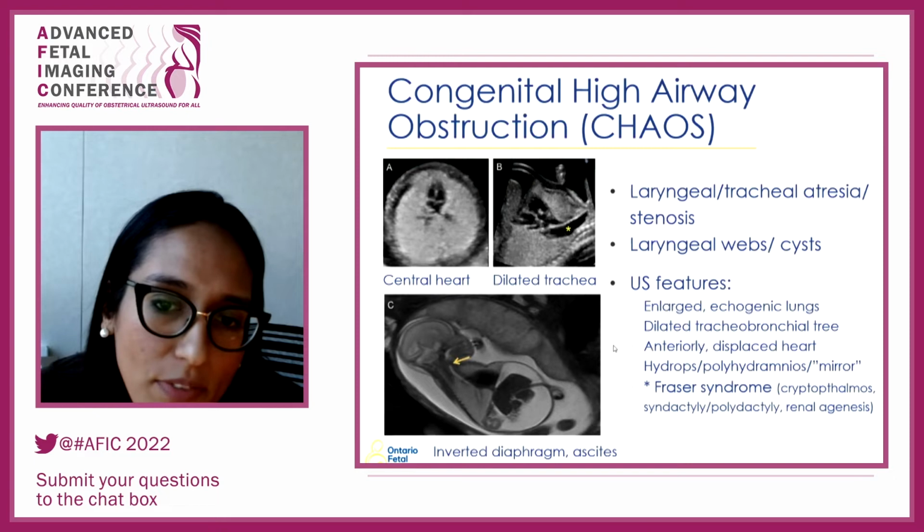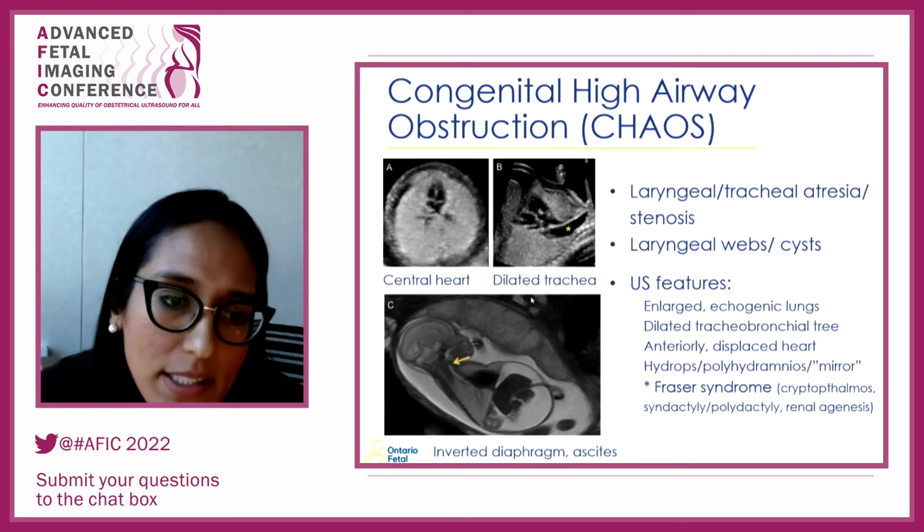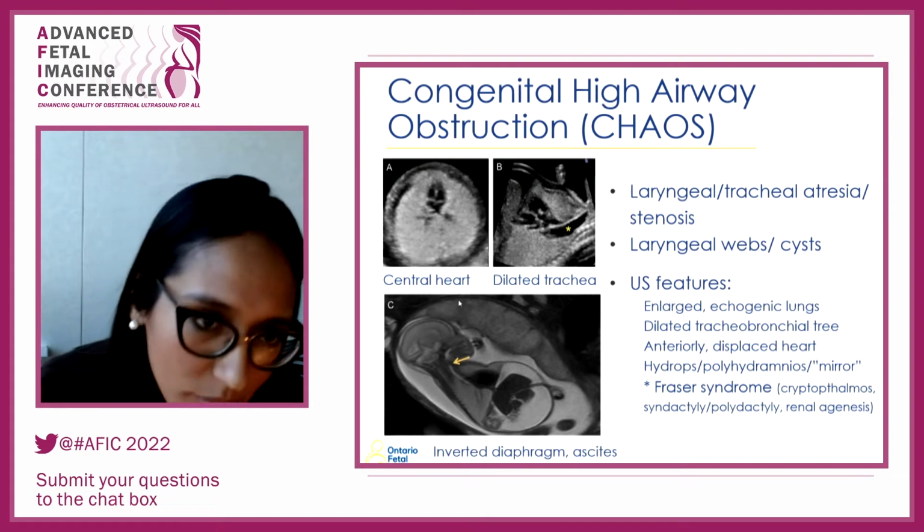These infants, or these pregnancies, unfortunately have a very poor outcome, but it is an important differential diagnosis. When we see echogenic lung lesions bilaterally, we should be thinking about a high airway obstruction.